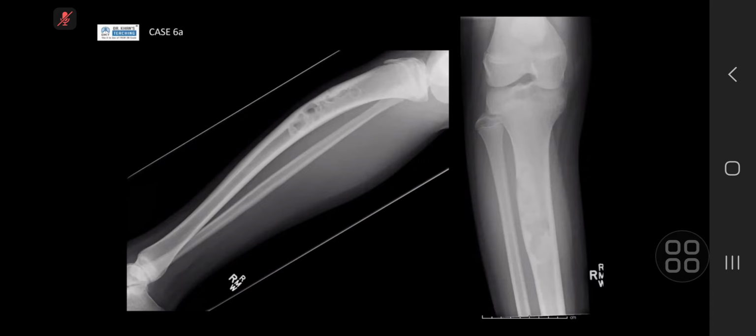Given the lateral and frontal radiographs of the knee joint and proximal leg, and a full leg lateral view, of a skeletally immature patient, I see multiple well-defined lucencies in the proximal metadiaphyseal region of the tibia, with sclerotic margins. The cortex is normal. There's no periosteal reaction.